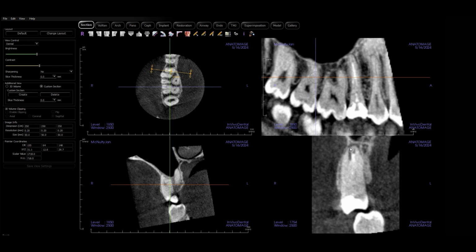Using that technique with paper points and gutta-percha points is often a way to gain some sense of what's happening here. With that said, if you get a CAT scan, you'll know the answer to the test before you take the test, which is why we advocate for CAT scans for all endo, especially upper premolars. If there's a tooth that requires a CAT scan, it's this guy right here for this very reason. Lower incisors is another one. Those are very tricky to do, in great part because they often have this 1-2-1, 2-1-2 iteration of the canal anatomy.